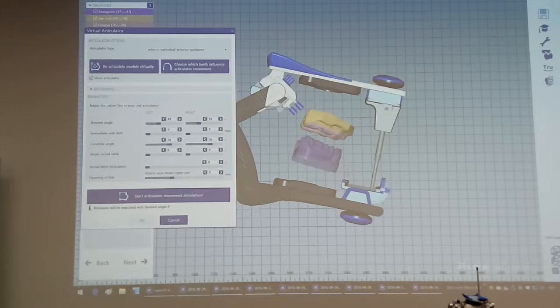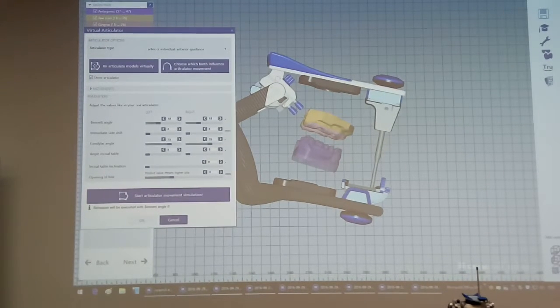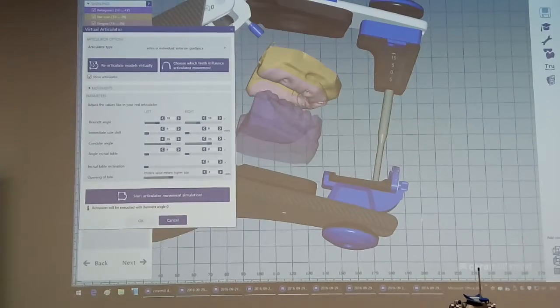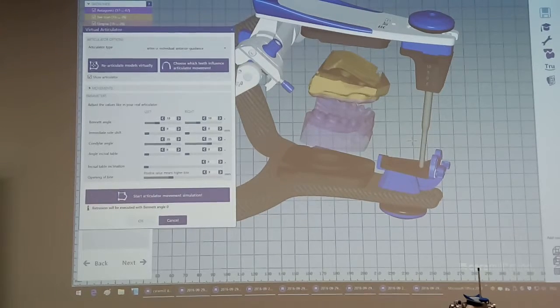When we have no table available like this here, you will never get natural front teeth. Because when I start the movements now, then it's moving against this pin on the table, and we have a flat occlusion plane. This makes absolutely no sense. That's why we need some information from the patient side. These are the same information what we have done this morning.